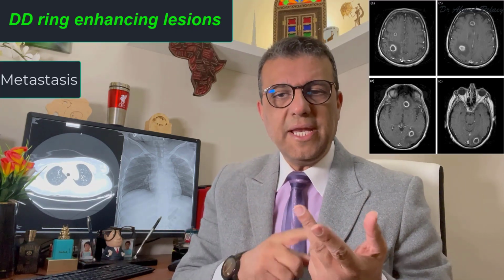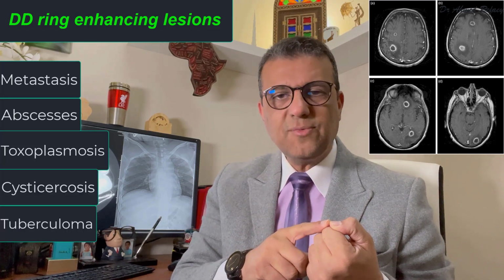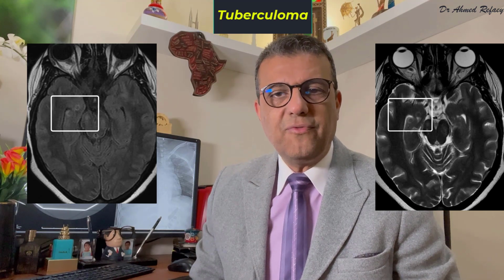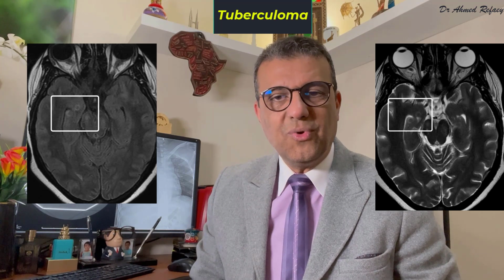The findings in MRI brain: we have innumerable lesions of ring enhancement with central low intensity. These lesions in T2 and in the FLAIR give low central hypointensity. The differential diagnosis of multiple ring-enhancing lesions in the brain are metastasis, brain abscesses, toxoplasmosis, neurocysticercosis, tuberculoma, as well as sarcoidosis. But the presence of central low intensity in T2 and in the FLAIR images raises the possibility of tuberculoma, because the other differentials give high signal intensity in T2 and in the FLAIR.